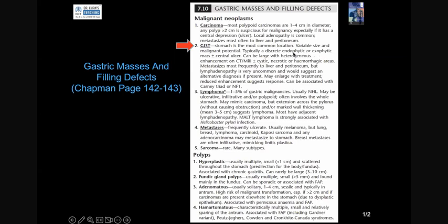So this concept that if it goes in, it cannot be GIST, you have to remember this. It can be within the lumen, it can be exophytic also. And it can have a necrotic center, and studies have told us that above 5 centimeters, there are chances of malignancy.